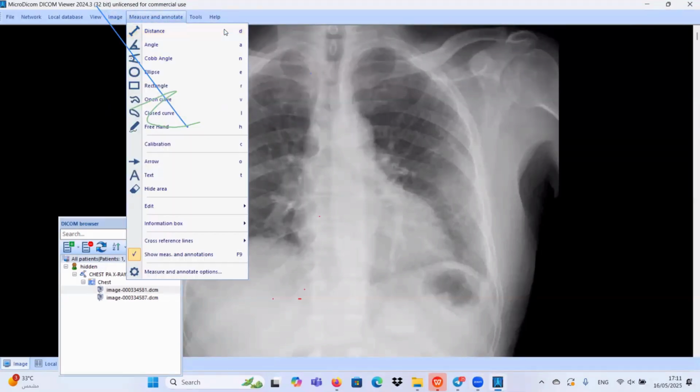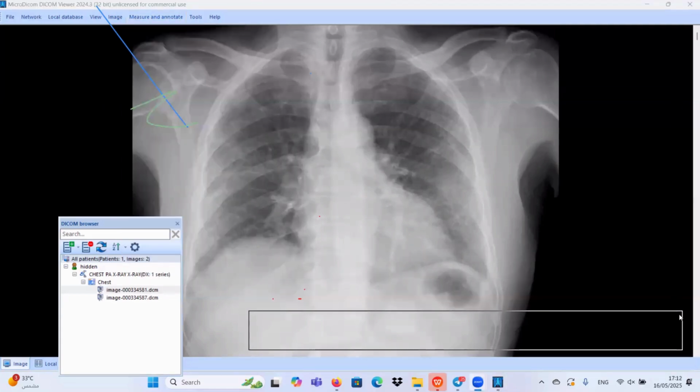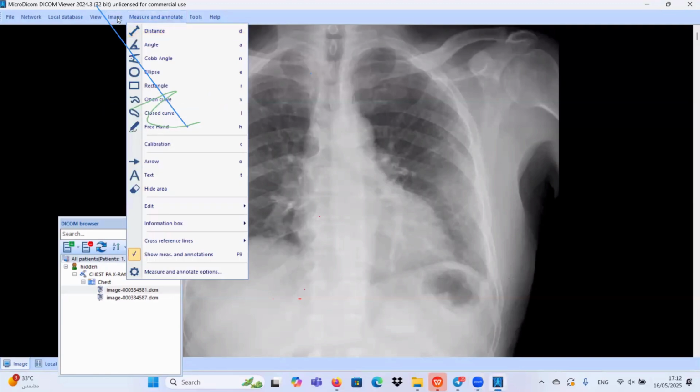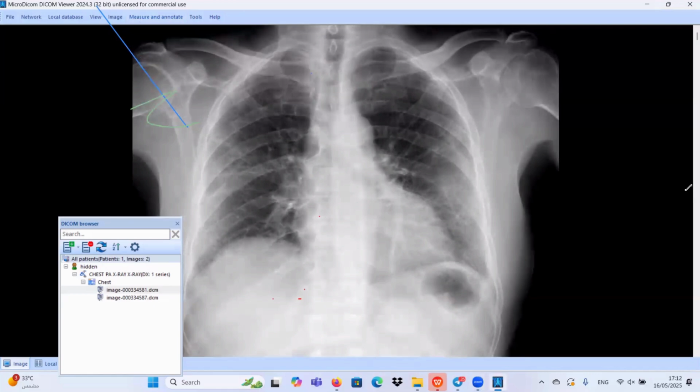The cardiac shadow is within normal range. The cardiac silhouette shows blurry margins, which are most likely due to the prominent interstitial changes. I am looking for any rib erosions, which are not present, or any underlying calcification. Bilateral hila, pulmonary arteries and aortic knuckle are normally visualized.